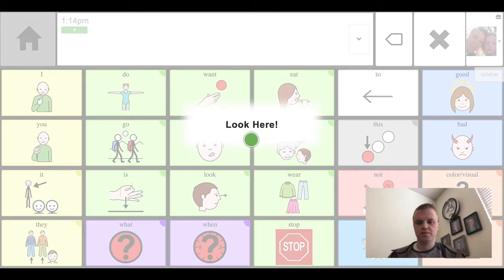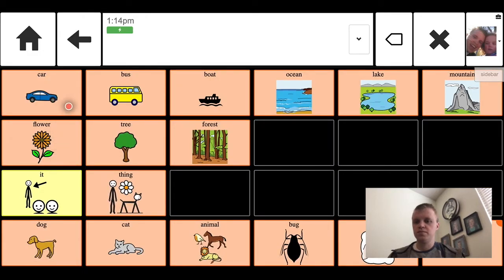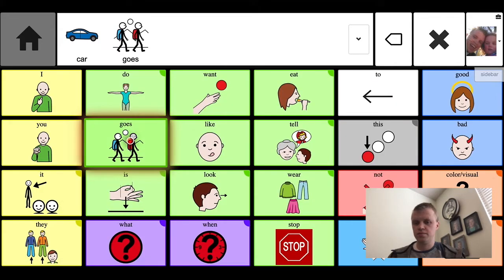These libraries allow us to use different selection techniques. So we can have button-based activation, dwell-based activation, or even expression-based for something like raising your eyebrows, smiling, or opening your mouth. Since it'll work on anything, whether it's a web browser or an iPad or an Android tablet, we want to get it out there so people can use it for evaluations and trials at the very least, but we also believe that it can provide value for specific users as well.